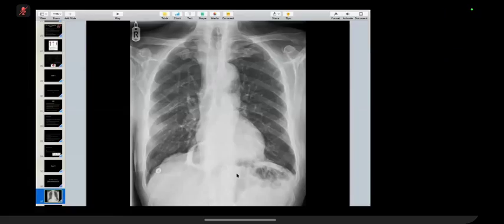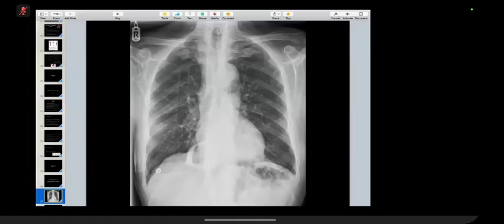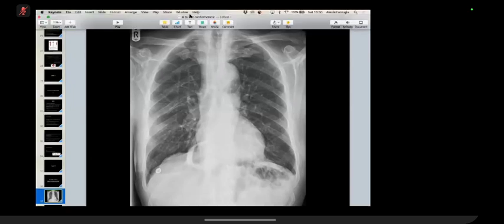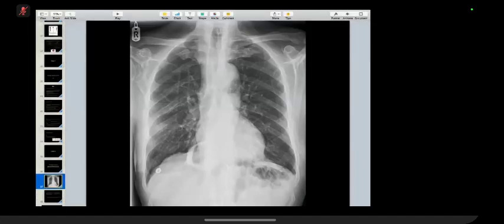I think it might be too proximal, so it's not appropriately placed. It looks like it's stuck within the sort of post-surgical residual stomach and would need to be advanced further. That's right. So what would you do in your clinical practice? I would immediately inform the team that it's not in the correct position and advise that they reassess and try reinsertion. Good.